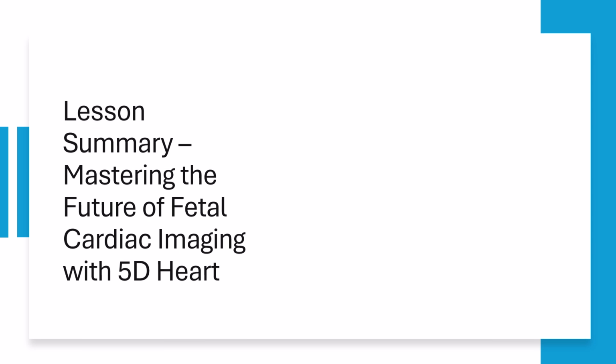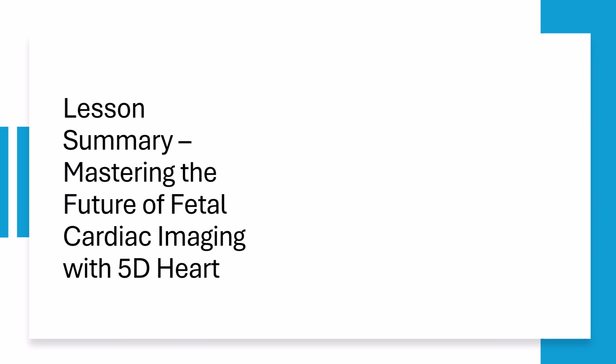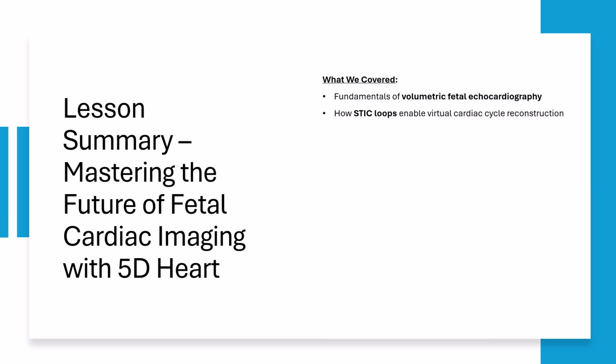Let's wrap up by zooming out and taking in the full view of what we've just explored. We started with the fundamentals of volumetric fetal echocardiography, then followed the journey from STIC acquired loops, enabling reconstruction of a virtual cardiac cycle, to automated and semi-automated solutions that are reshaping how we interpret fetal heart anatomy and function.